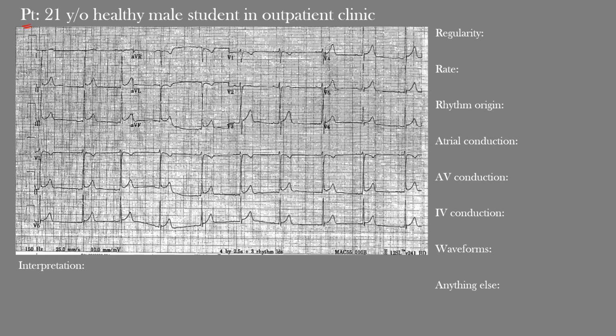So let's get started. Our patient this week is a 21-year-old healthy male student that comes to us at our outpatient clinic with this EKG. Pause the video and take a few minutes to go through everything we discussed and try to fill that out yourself on a piece of paper. When you're ready, start the video and we'll go over it together.